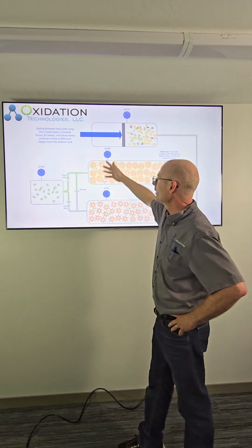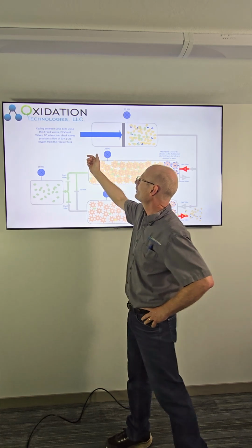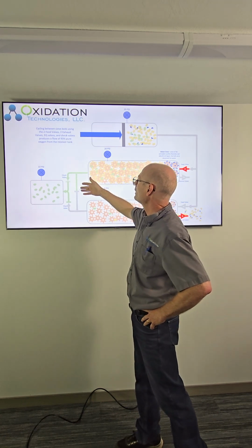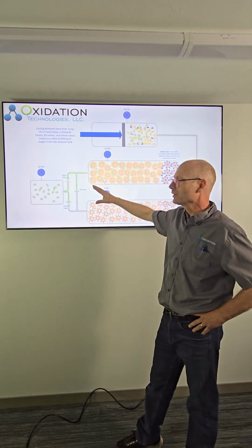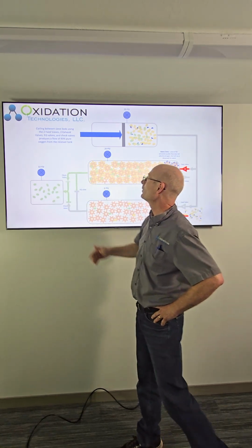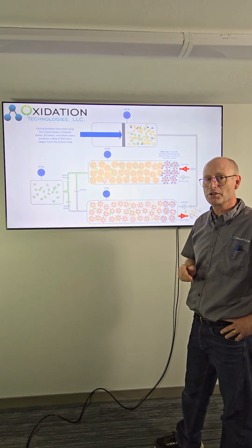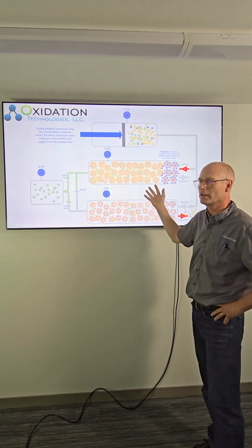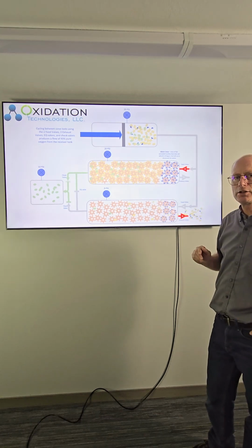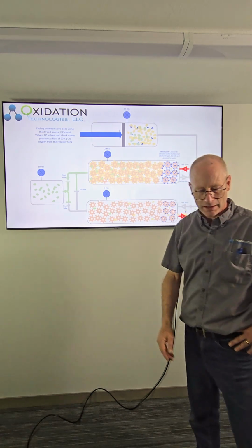And at this point, this continuous cycling between these, we've got two feed valves, two exhaust valves, this EQ valve and check valves. When they all work together, we can get up to typically 93%. I think 95.5 is the theoretical maximum purity of oxygen because you're just removing the nitrogen. There's a few other molecules of gas in air as well that get mixed in with the oxygen.